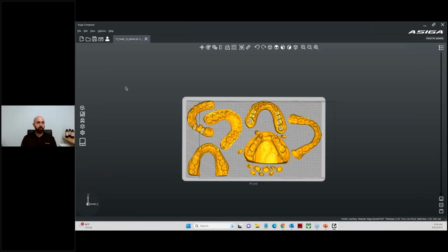And so a common question we get is, how do I get to my web interface now with the change? It is still here under the new icon for web interface.